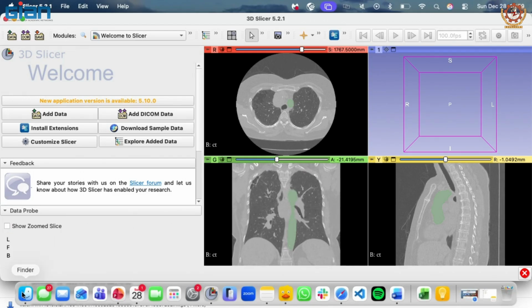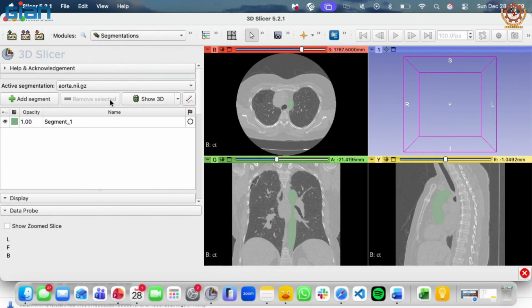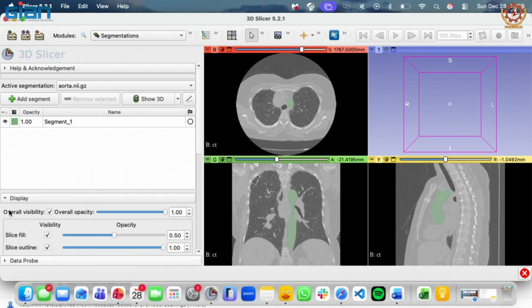Okay, so this is the aorta. Any problem uploading the aorta? No, right? The aorta is not visible. Wait, the green. Oh, it's not visible here. Or it's not visible for you. That is not a problem. We just learned how to do this display and everything. How about now? Still not visible? That is the problem with the light. You can see the green segmentation here, right? Okay.